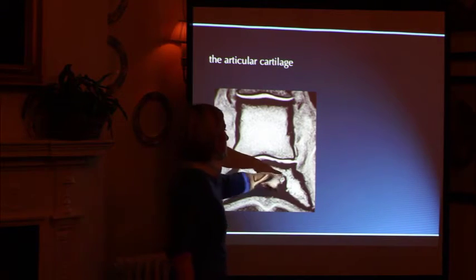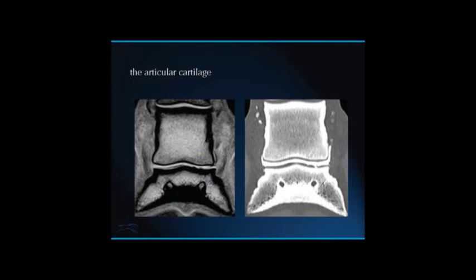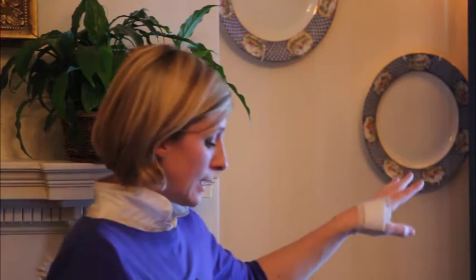So we looked at when we had this appearance. Here we've got the medial side of the joint, so the horse tends to lean and the joint surfaces oppose here. These areas of low signal, these little irregular subchondral areas there, we saw those quite regularly, and sometimes wondered if they were real or not. And with having a CT machine, we've been able to try and replicate these lesions using intra-articular contrast to actually see that these are true areas of cartilage disease. You don't have to do that in every horse, but if you do it in some horses, then you'll soon get the idea of what is real and what isn't real. And it does correlate well.